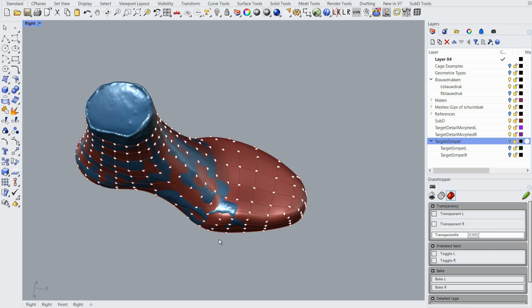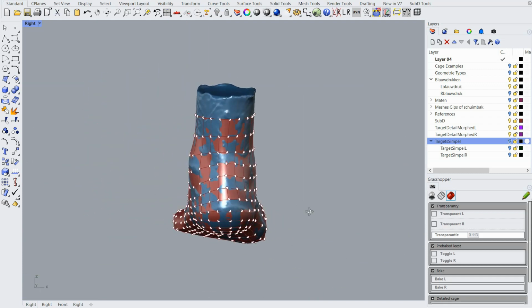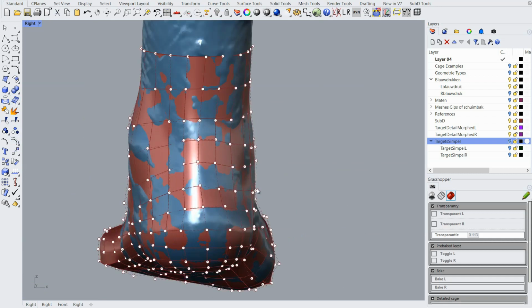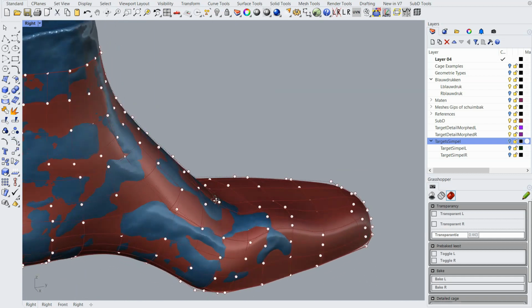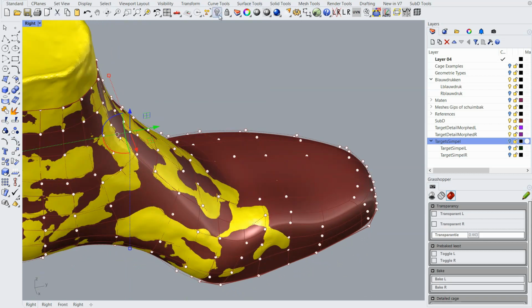So again, you can speed up the video if you want, but I'll show you in real time what I'm doing. I'll switch on the control points, it's easier. Okay, let's start with this point. I'll lock the scan.